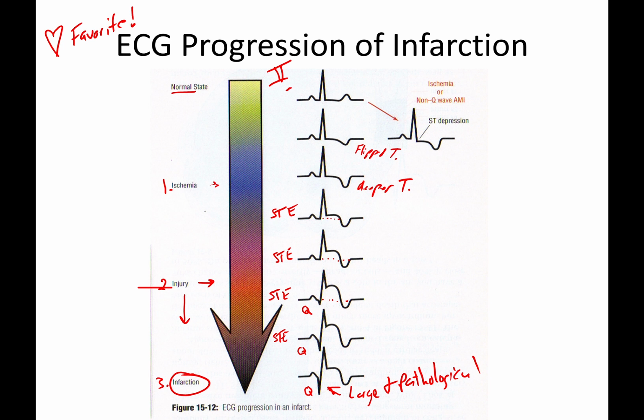Keep in mind that the damage is going to be reversible, maybe even up to this level here.